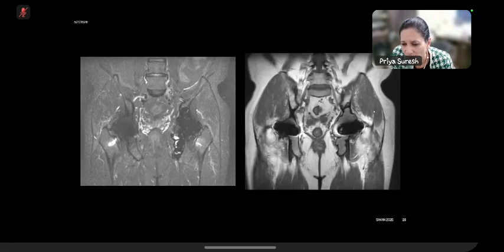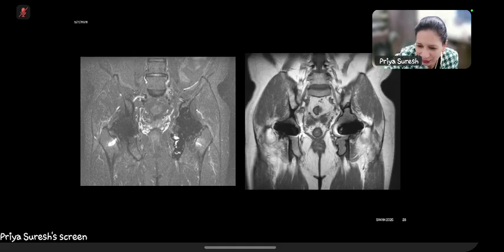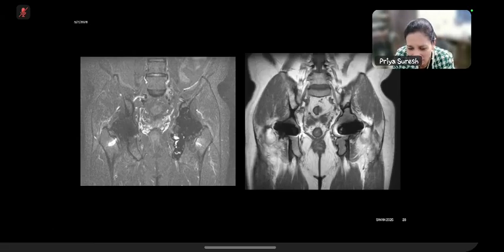So on the MR, with experience, I think comes some knowledge as well, and things that you notice is you do MARS sequence, yes, and you do a STIR sequence, yes, and usually you think STIR sequence is best to look for collections, for tumor like lesions and things like that. But when you're looking for osteolysis, when you're looking for pseudotumors, especially osteolysis, yeah, best seen on T1.